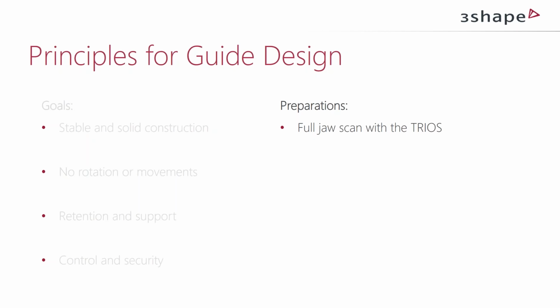And this is a key element also to secure the digital accuracy we were talking about previously, because the design of the guide is also depending on the quality of the scans as much as also going to depend on the actual design and the material thickness, but also the type of machinery being used. And all of them are components influencing the final outcome of the guided surgery. Very good, thank you.